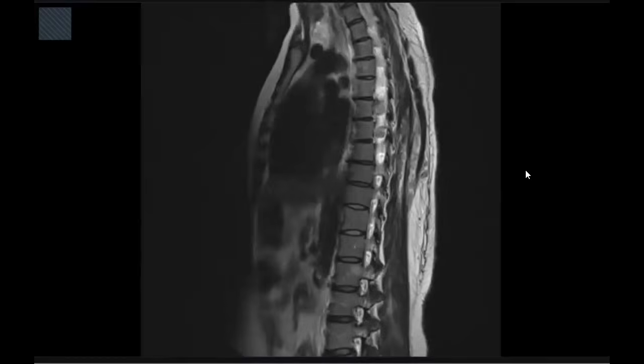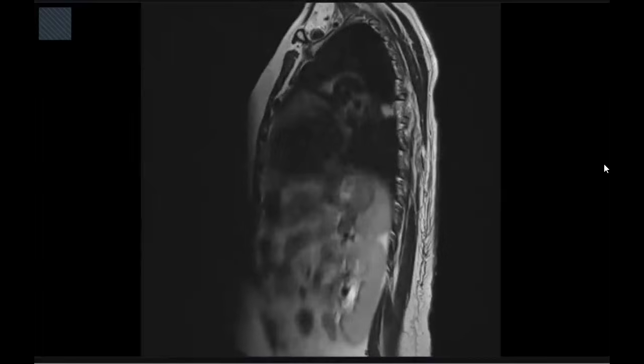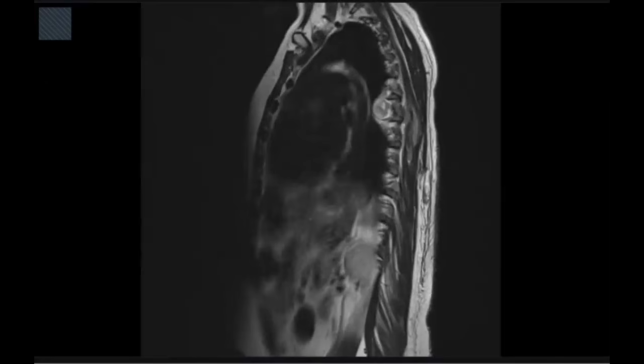I will show the scroll bar. Look at yourself while you are scrolling.